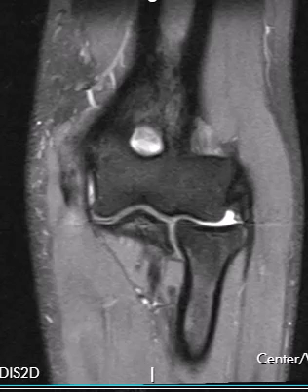Hello, this is Dr. Gay from First Look MRI, and this is a patient who is a pitcher. They're 16 years old, they had an injury 1 month ago, and they still have pain of their left elbow joint. And we suspect that they have an injury of their ulnar collateral ligament.